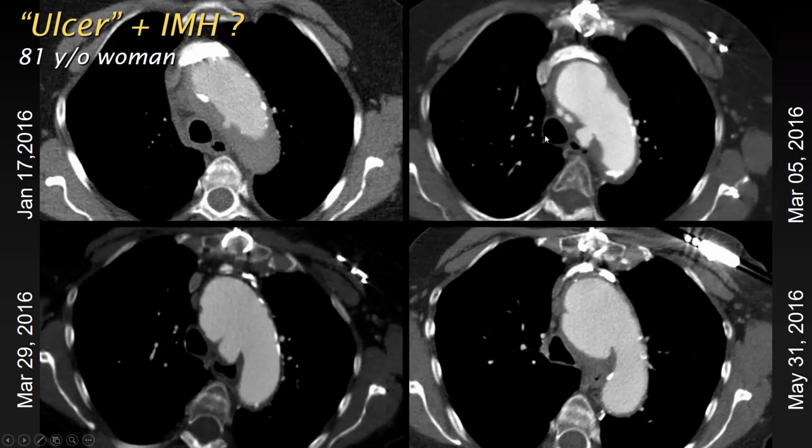So again, the total diameter wasn't really that large, but then we just did a short follow-up, like I think this is just like 3 weeks later, and now you see a coalescence of these lesions here. And again, a few days later, ultimately this became like one large outpouching. You could consider this all one large false lumen, if you want. So that's a consequence of one of these larger focal intima disruptions. So they really can behave badly and have a bad prognosis.